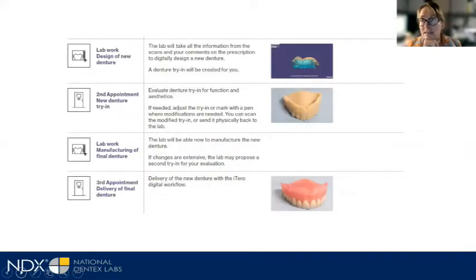Please know that in the notes section, you can indicate any type of notes that you want to. You can also take a screenshot of some different information that we see on the screen after our scan. An example of that might be the patient has an existing denture and maybe the midline's off a little bit, or now their bite has a little bit of a cant. You can take a screenshot, make some annotations, both in text and draw a picture, and we'll do a demonstration of that as well. And so it's really a great communication tool.